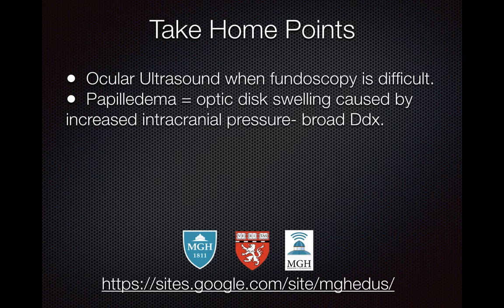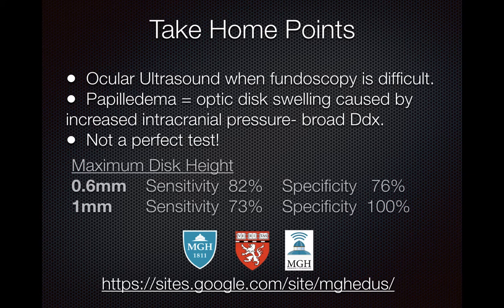This patient was a little bit textbook because she was an otherwise healthy, obese woman with a new onset headache for 2 months. And remember that it's not a perfect test. It's not as well studied. And the recommended cutoffs from that paper that I showed you were either 0.6 millimeters to increase your sensitivity, and anything above 1 millimeter has better specificity.